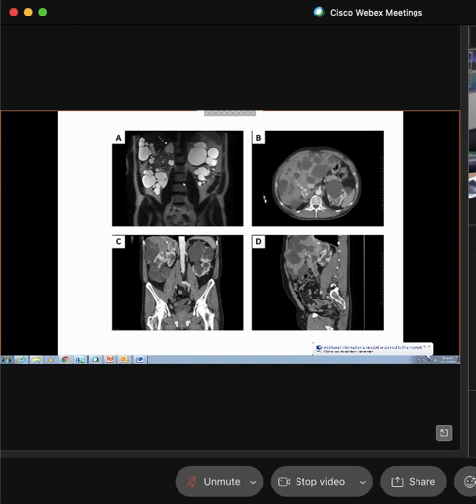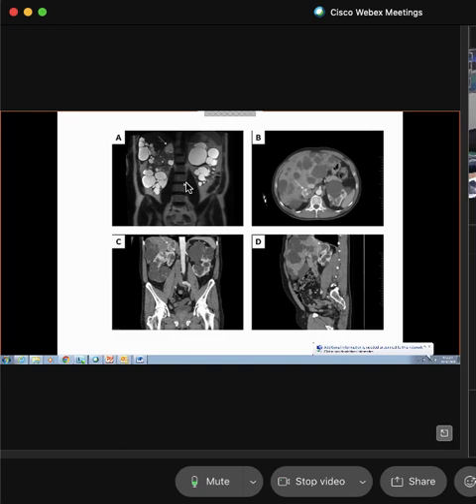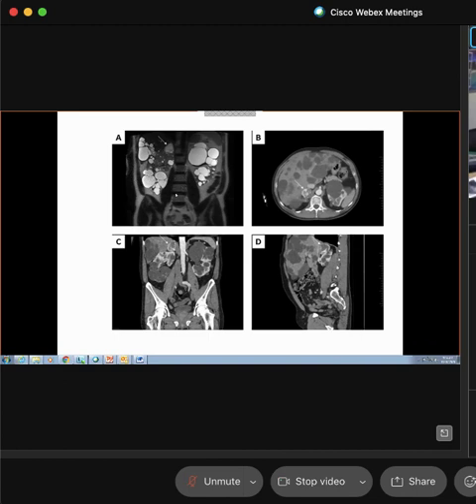Good, Miss Jaleisha, I saw that you put C. Tell me why you think C is more of an anterior slice over A. You are correct. Because in A, you can see the spine, which is more posterior than what you can see in C. Absolutely. Bravo. If you can see the spine, because the vertebrae lie most posterior, even though there's a lordotic curvature. Once you get past the spine, there's really nothing else other than muscles and then skin.